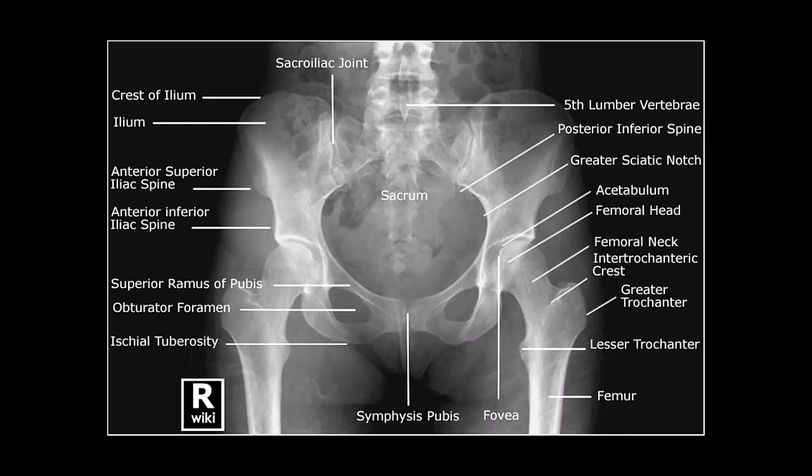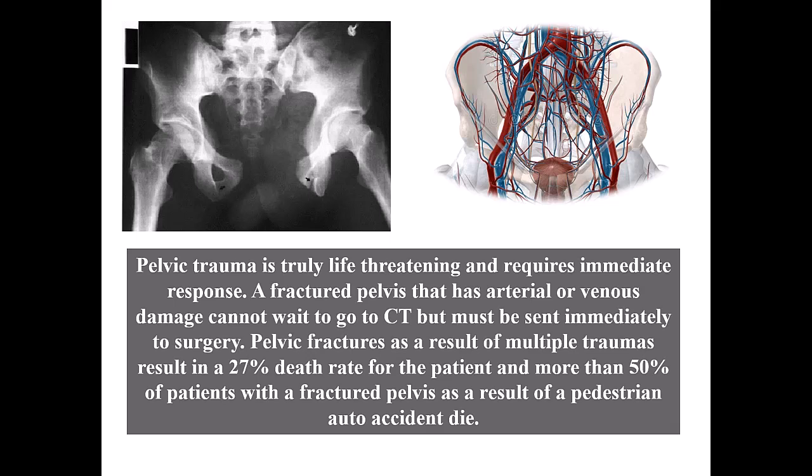Our last of the big three exams is the pelvic exam. Take a close look at the normal anatomy of the pelvis and think about all of the areas that are being protected by the pelvis. Pelvic trauma is truly life-threatening and requires immediate response.